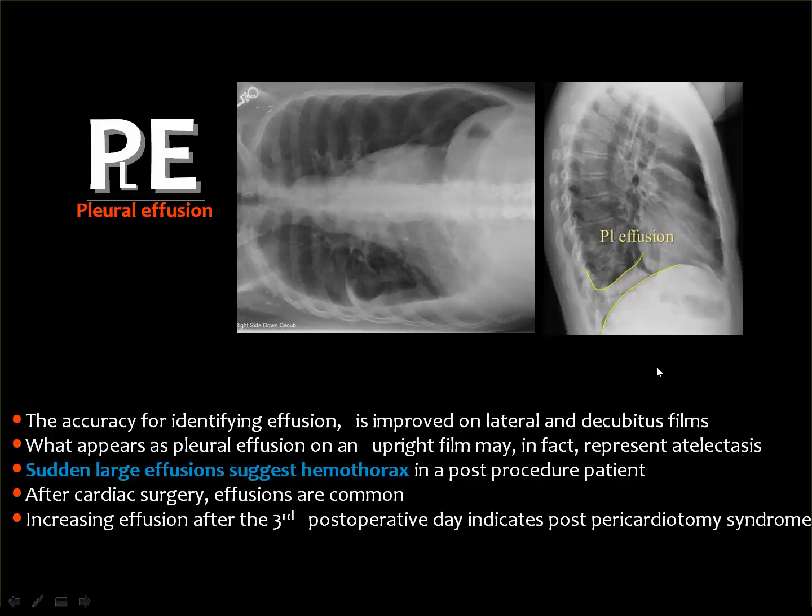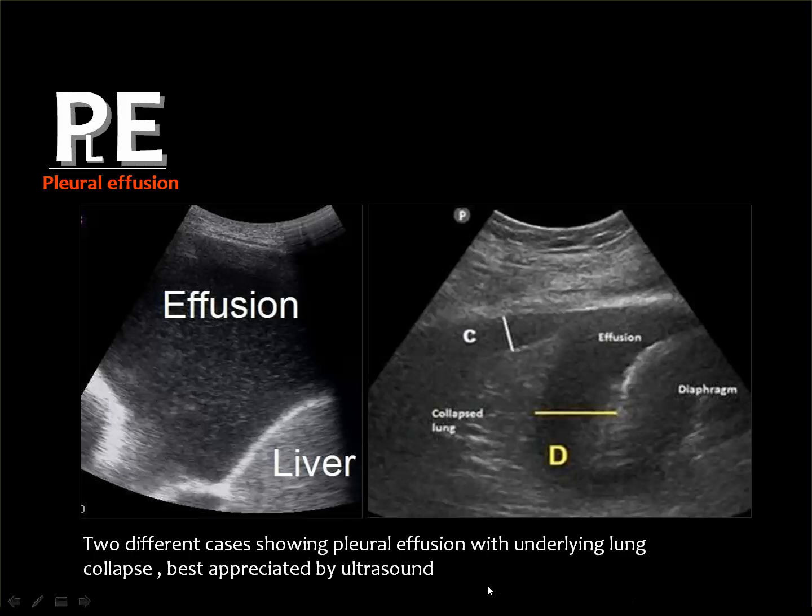And in the previous days, when you suspected the presence of pleural effusion, especially if you have the lateral view, which is not commonly performed for ICU patients, you see that the fluid collects in the posterior costophrenic angle, which is deeper than the lateral costophrenic angle. And we used to do the lateral decubitus film to see that the pleural fluid is trickling into the pleural space.